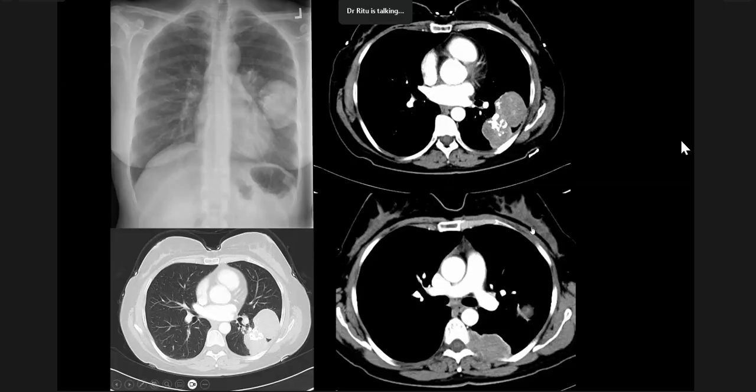So the surgeon took her to the OR, and they opened and they closed her. And then many years later she came to the United States, and she got this radiograph. And you can see that it's a very confusing picture, because one, it is not solitary. Two, this one is pleural based, but then this one is in the fissure, which is technically also pleural based. But could these be infected hydatid cysts, or could this be fibrous tumor of the pleura?